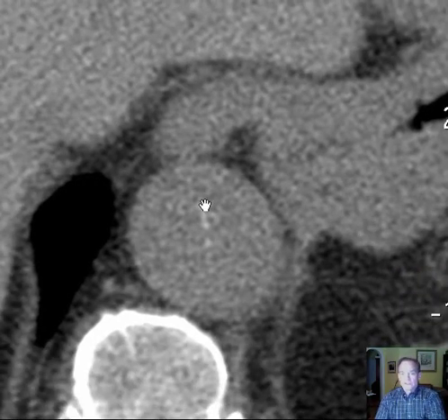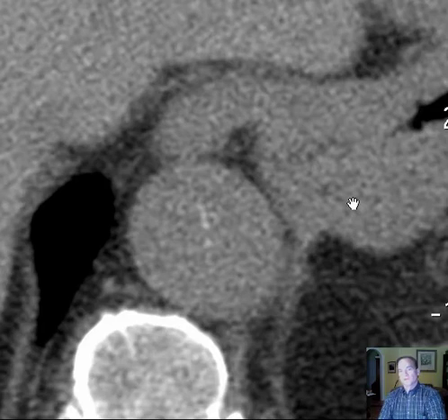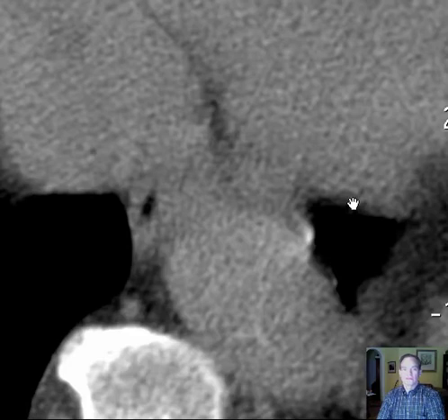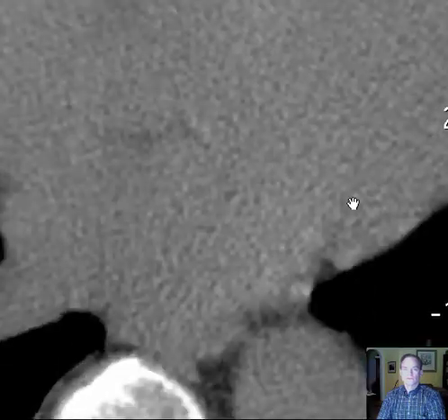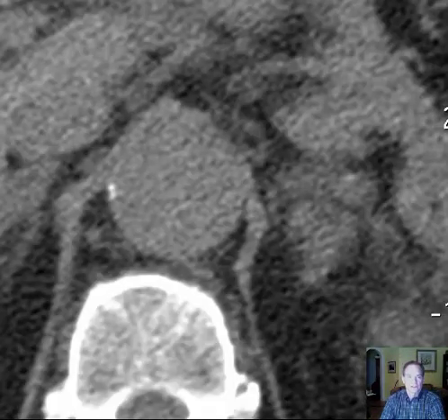So what would cause the intima to be displaced from the aortic wall? A dissection. This is, by definition, an aortic dissection. Life-threatening condition that often requires emergency surgery. So that's what we're diagnosing here.